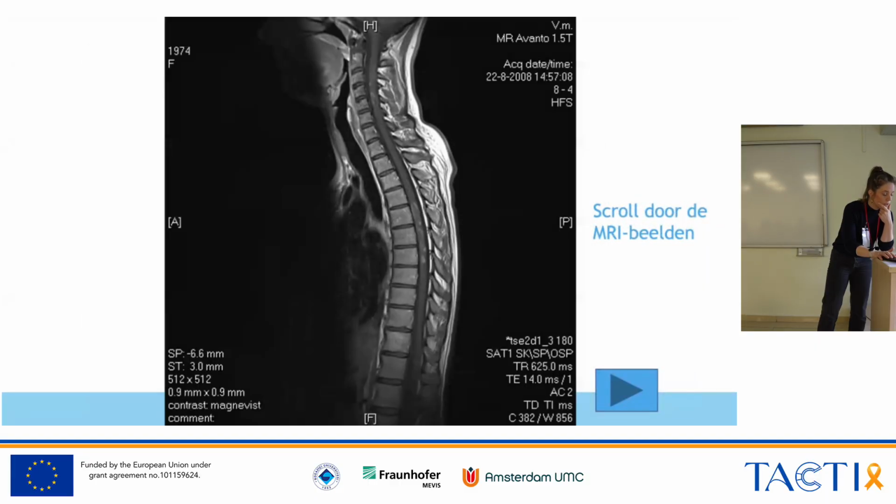And then you look at the spinal cord. This is also a post-contrast scan. I hope what you see here is that there is also severe contrast enhancement, here in the cervical spinal cord. And Vera, what do you think of this aspect? Yeah, so here it is quite striking.